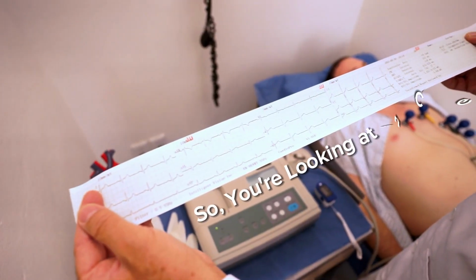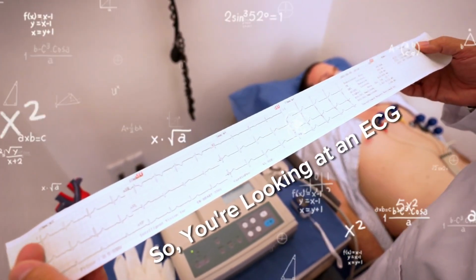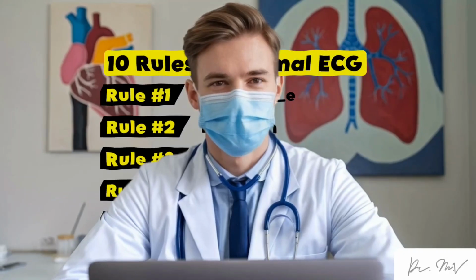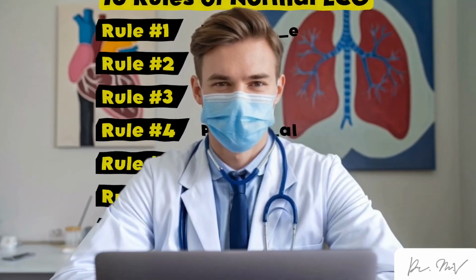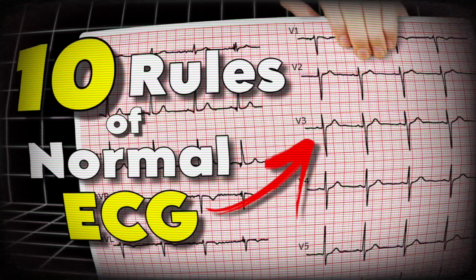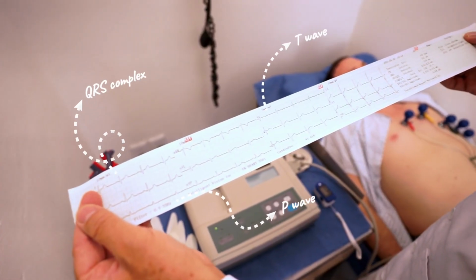So you're looking at an ECG and you're wondering, is this normal? ECG interpretation can be tricky, and even experienced doctors sometimes miss subtle details. But don't worry, today I'll break it down into 10 simple rules that will help you analyze any ECG with confidence. By the end of this video, you'll know exactly what to look for.